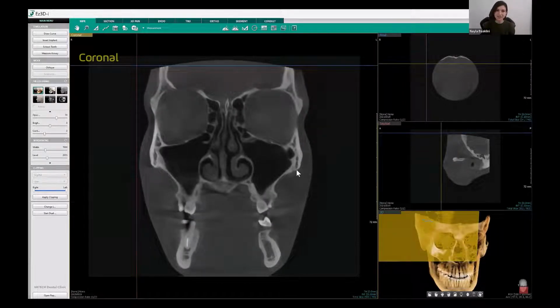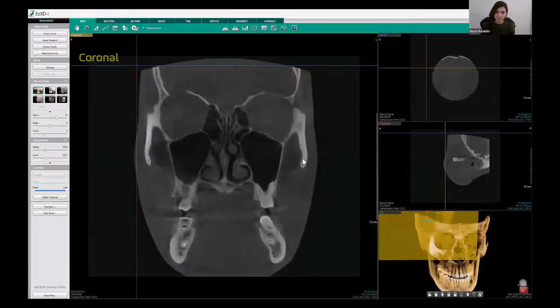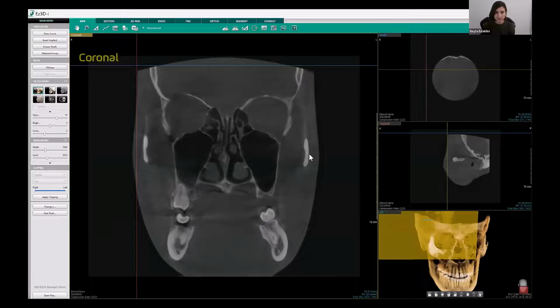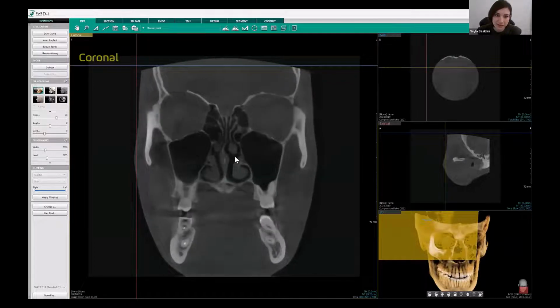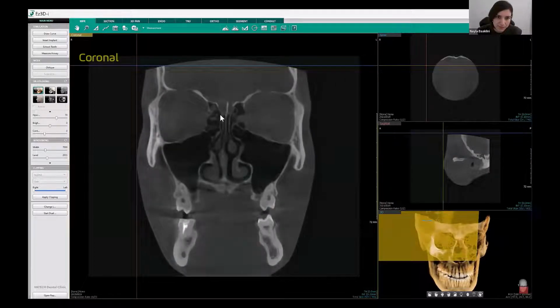Let's look bilaterally at the zygomatic arches right there. Zygomatic arches. We are going posteriorly in the orbital cavities. Going back anteriorly for a second, look at the crista galli and cribriform plates on the ethmoid bone right there.